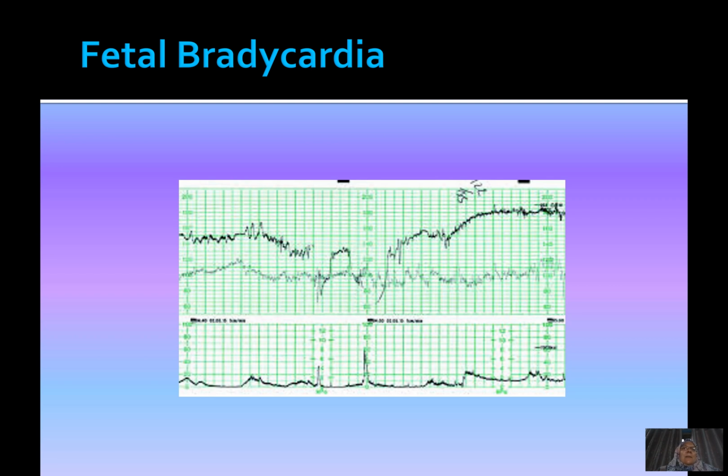Yeah, so I'll start. If we look for contractions first, maybe there are some tightening, some contractions, but no regular contractions visible here. Then you look at the CTG and you see 2 recordings. The first recording, underneath, looks like a recording of the maternal pulse, and the highest line is the fetal heart activity. You can see that the normal baseline rate was around 140, and variability good. A few little accelerations even possibly seen, but then you can see a drop in the baseline rate, actually probably a prolonged deceleration of 4 minutes. So this is just on the borderline between prolonged deceleration and fetal bradycardia.